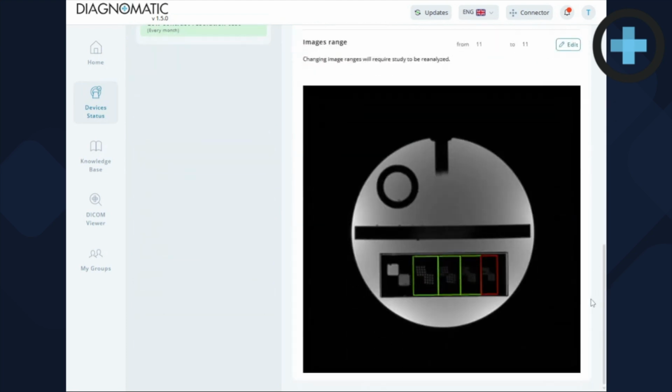So now if we look at spatial resolution, it's the slice that we have here. The high contrast spatial resolution test assesses the scanner's ability to resolve small objects when the contrast to noise ratio is sufficiently high. It evaluates how well the MRI scanner can distinguish fine images. This is defined by the size of the imaging voxels. These are the voxels down here. Since these voxels are 3-dimensional rectangular solids, the resolution is frequently different in the 3 different directions. The size of the voxel and therefore the resolution depend on the matrix size, the field of view, and the slice thickness.